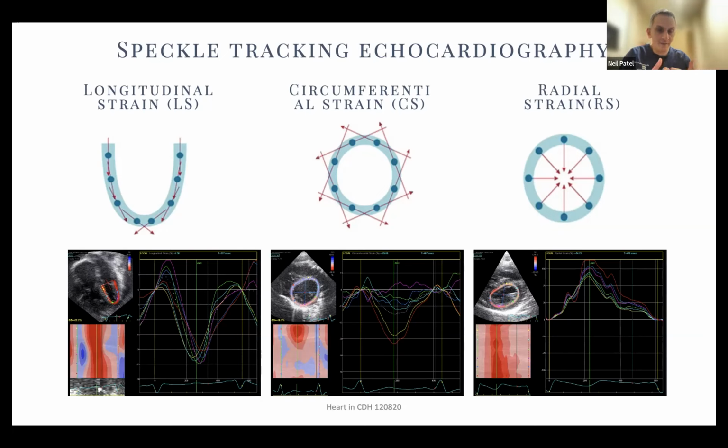fibers. And the beauty of Speckle tracking echocardiography is that if we've taken the correct views, we can start to look at that relative shortening or lengthening in those planes that coincide with the muscle fibers within the ventricles, and therefore within their planes of normal contraction and elongation.